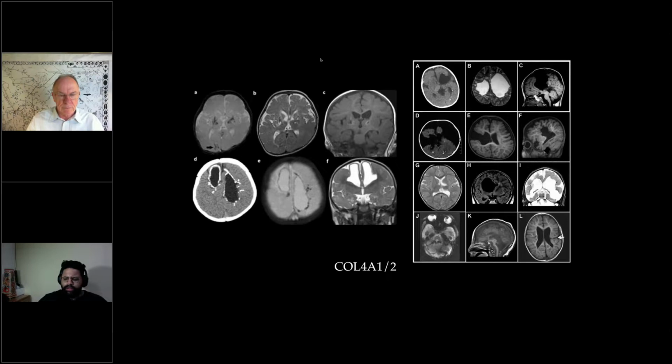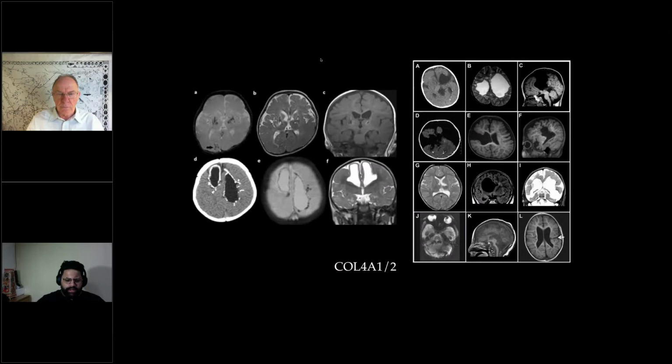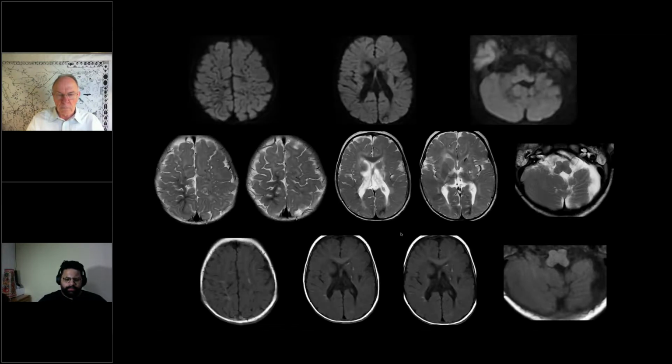I was asking whether this child has calcifications. I'm not sure. This could be hemosiderin, not a strong calcification. This is on the GRE, so I don't have a CT. Maybe a CT would be helpful. I'll do a CT when they come back. Okay.